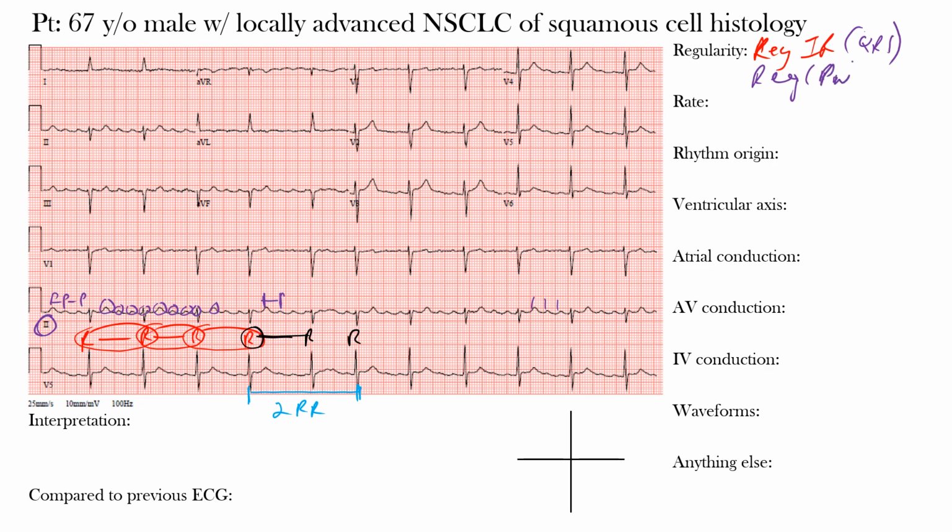Okay, and that may give you a clue of what the underlying rhythm will eventually be. So what did you get for the heart rate? Well, we have an irregular rhythm in terms of the QRS complexes. So we want to count the number of complexes going across that 10-second standard EKG that we have here, and then multiply that by 6 to get an estimate of the rate.